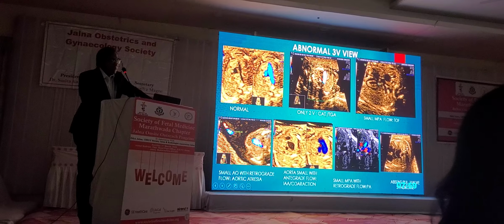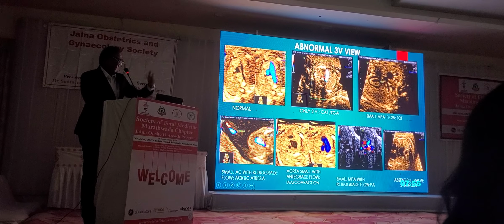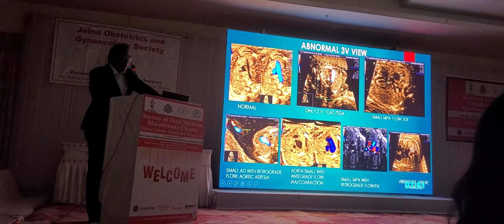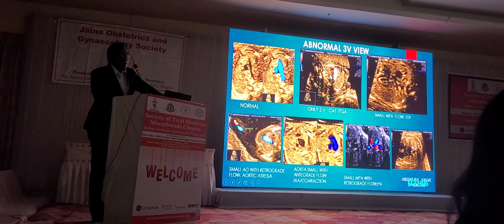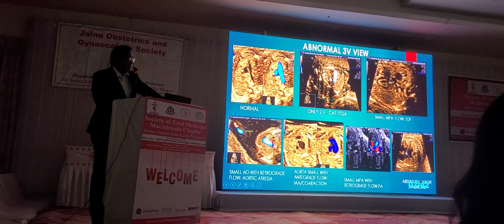Now next we see a narrow pulmonary artery with reversal of flow, which can be seen in case of pulmonary atresia. There are two types we will just see in the next section. Here you can see the grossly dilated main pulmonary artery and right and left branches, that is seen in absent pulmonary valve syndrome. In the end, you will see a few clips of this.